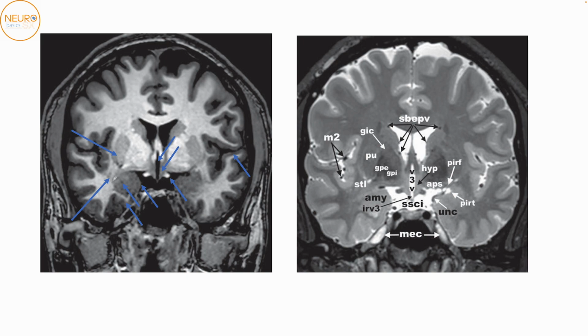As we go further posteriorly, again, we can see the temporal stem, the amygdala. We are still going to call this grey matter the amygdala because until we see the temporal horn, we're not going to call this the hippocampus. This here is the uncus. This is the entorhinal cortex as we have discussed previously. This is the third ventricle, and this is the hypothalamus.